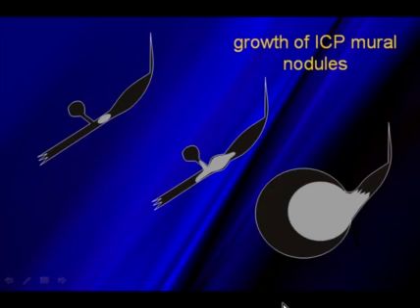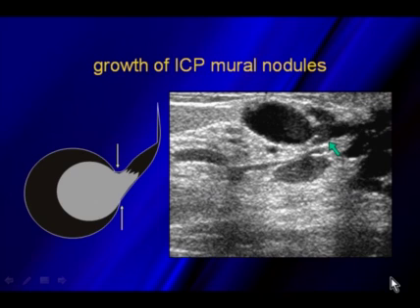If we look at the growth of an intracystic papilloma, they start within the ductal system. As they start to grow and spread, you can see how they will obstruct the neck of this, and then a cyst basically will form around that. So if we draw our imaginary line, you'll see that there's extension coming down the area where the duct is. And here's just an example.